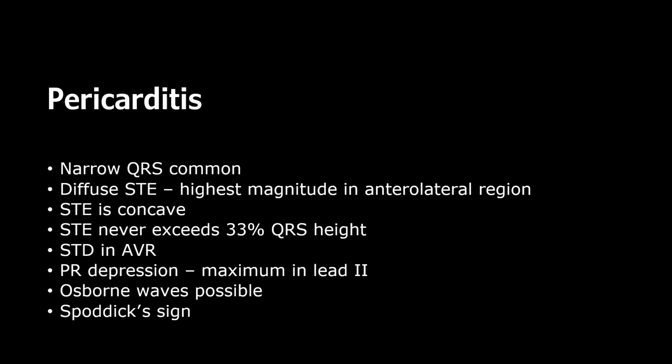There are a couple other things that you can see. It's debatable, but some people go back and forth about whether Osborne waves can be present. I have an example with them present. You also have PR depression that can be present, and you can have ST depression in aVR.